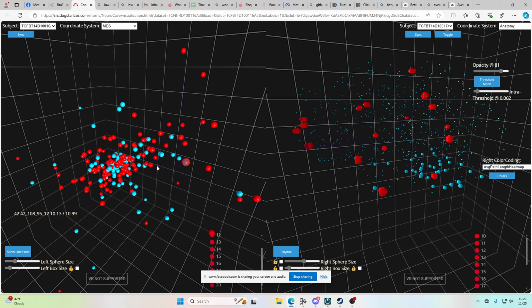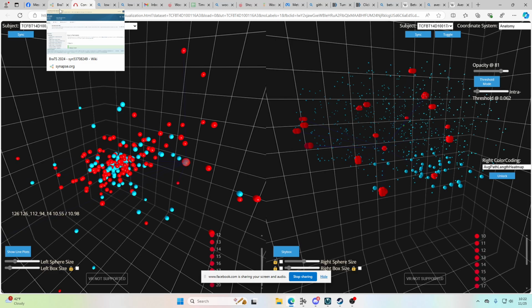But comparing drugs and protein interaction networks is something this can also be useful for, as another aim. The data set I'm also currently exploring is for protein complexes.